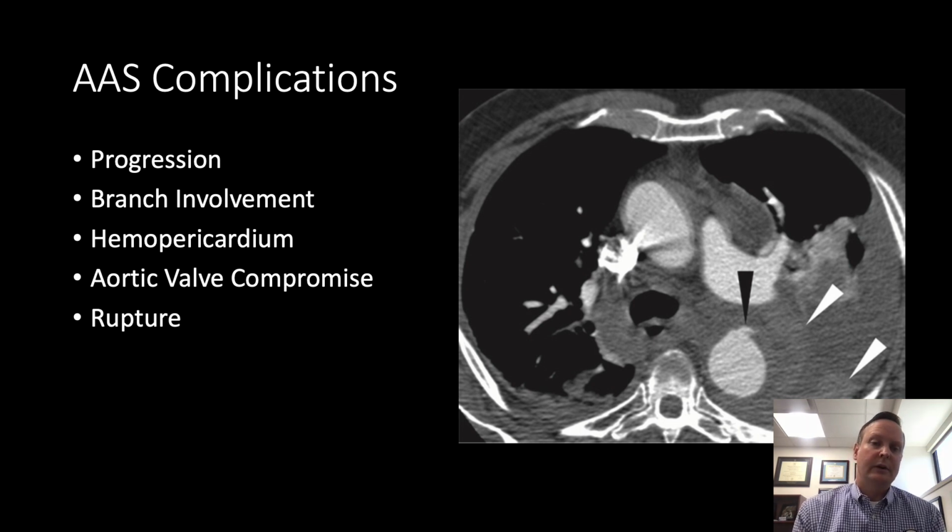In this patient, we see a descending aorta with a small defect representing a penetrating ulcer, although we have surrounding high density, which is extending even beyond the expected margins of the aortic wall into the mediastinum, with high density layering in the pleura.